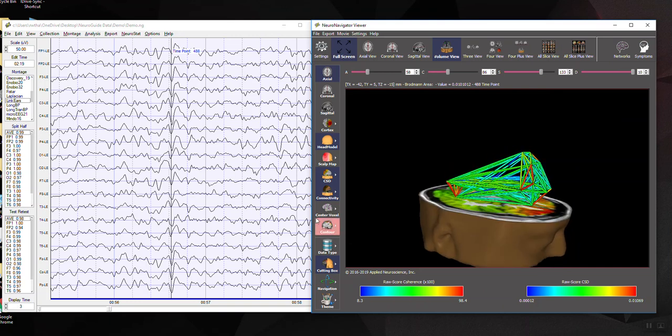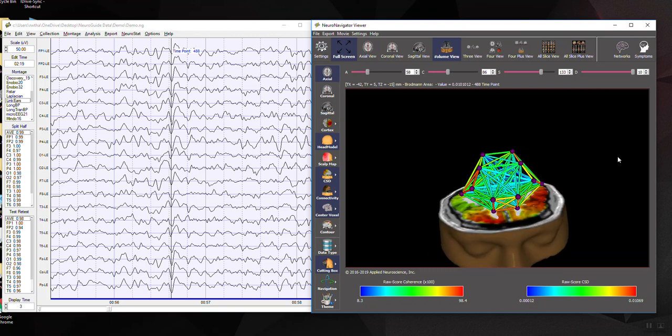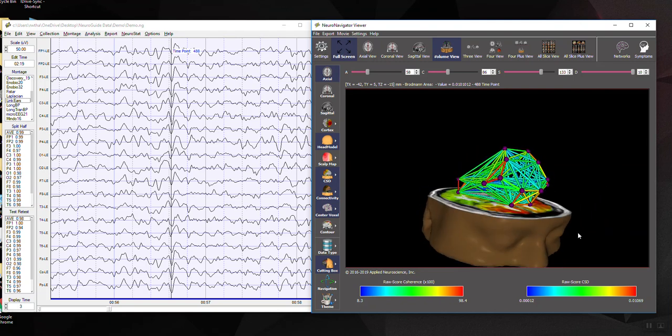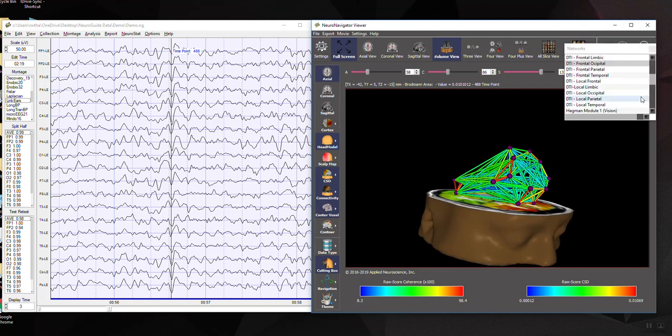Now we're looking at the hubs. Now I'm going to click on the center voxel so you can see the center voxel here is the center voxel of the Brodmann areas that correspond to these different networks. I'm going to click on down so you can see more of the networks are available. There's Hagmann hubs as well, and then more of the Catani-Dell'Acqua networks based on diffusion tensor imaging, Mesulam's data as a neurologist evaluating functional networks using PET scans and functional MRI, and then the interconnectivity networks published by Laird et al.